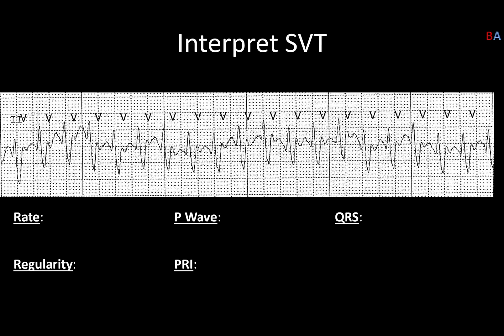All right, looks pretty ugly, doesn't it? I will just go ahead and open up with this and say, check the patient. Now, actually, in reality, this is a patient I was taking care of. I was actually standing at the bedside when this rhythm occurred, so I knew what was going on, but if I wasn't at the bedside, sure as heck this would get my attention, and I'd go scurrying in there to try and figure out what's going on. And I'll talk more about this patient's history, but first, let's go ahead and pick this one apart, shall we? So we'll switch colors to green here, and we'll number them off.